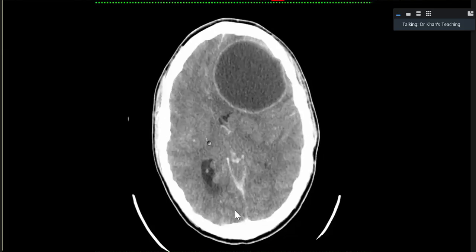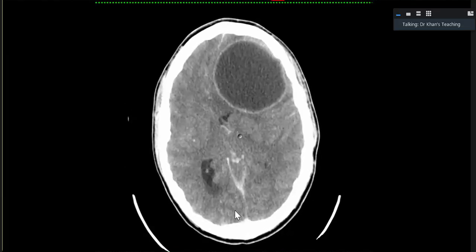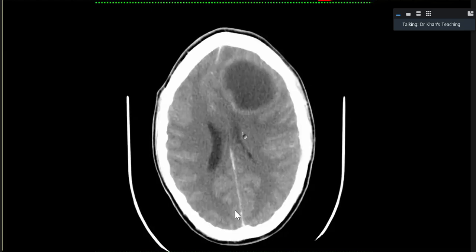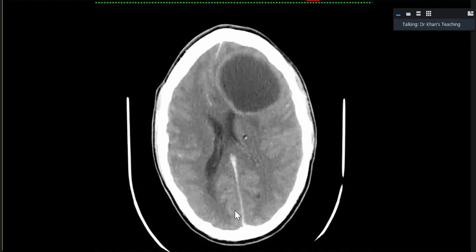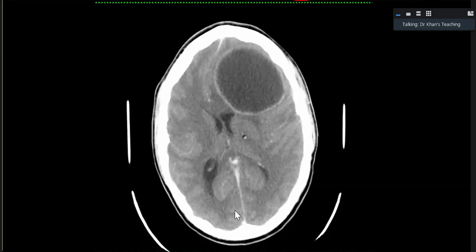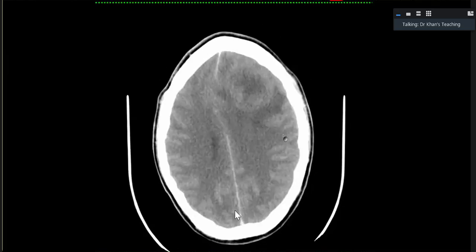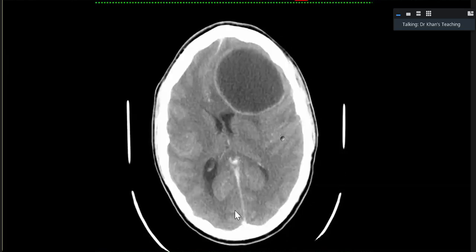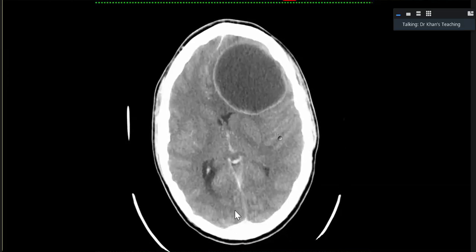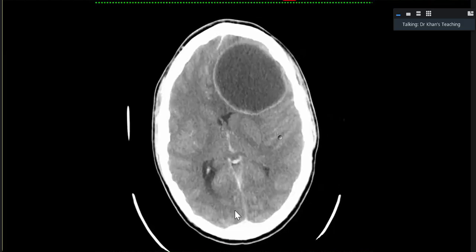What is the reason? This is unilateral hydrocephalus because the foramen of Monro is compressed. So it will be a good idea in your description to tell the examiner, don't waste time, but instead of just saying subfalcine herniation, say why it is subfalcine herniation. You can see midline shift, compression of the ipsilateral frontal horn, and dilatation of the contralateral temporal horn, overall in keeping with subfalcine herniation.